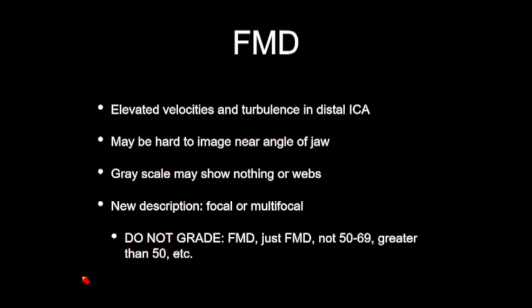The thing that's difficult is that most of us want to grade FMD, and the current recommendation by the FMD committee is you don't. You just say FMD is present. From a point of view of description, it either has one focal area of FMD or there can be multiple areas of FMD. And so their description is focal or multifocal. In this case, there are multiple webs, and therefore it's multifocal FMD.